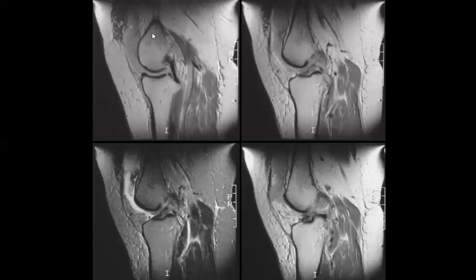Let's have a look at these images. Sure that when you see such a sagittal image, you are searching for the meniscal tears or any injury for the menisci, and also for the ligament injury, right? So what do you think about here for just these selected images?